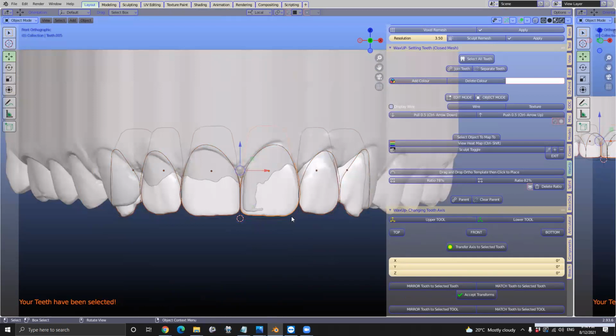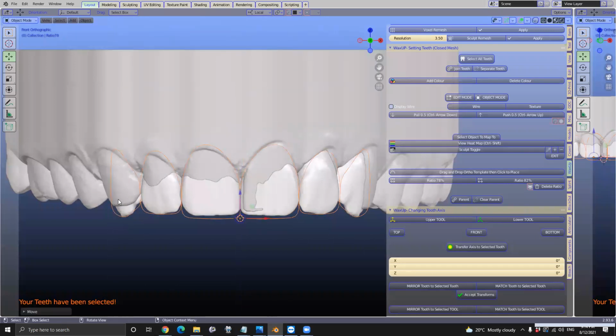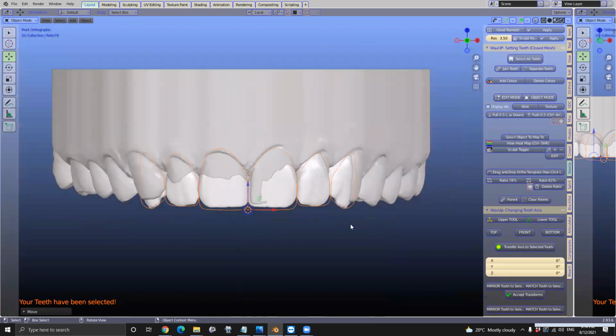And what we want to do is ascertain where this stencil should be, the 78. Notice that this red proportion does not extend all the way, because in Blender we're working with orthographic mode, and the red proportion is more designed for photographs. So there's a bit of a discrepancy happening here. So maybe in the future someone could invent a little bit of a different proportion that actually is more suitable for digital, but yet it still gives us a really good idea, as you can see.